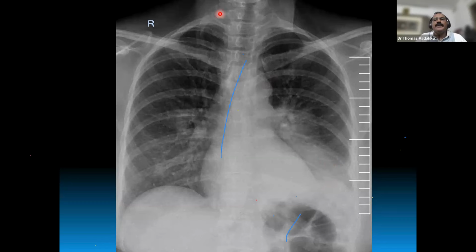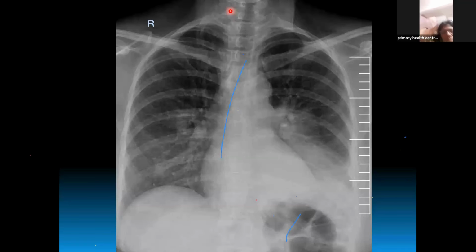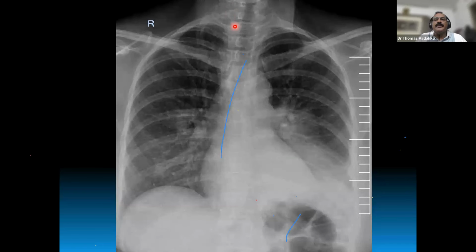That should be the diagnosis. In addition to that, you can see the cervical rib. You can see a small rib which is going to the cervical transverse process. How to identify cervical rib? You have to see the transverse process of the thoracic vertebrae, which is upward. You can see these are the upward transverse processes of the thoracic vertebrae. But the cervical vertebrae will be transverse possibly downward. So this rib is going to the cervical vertebrae.